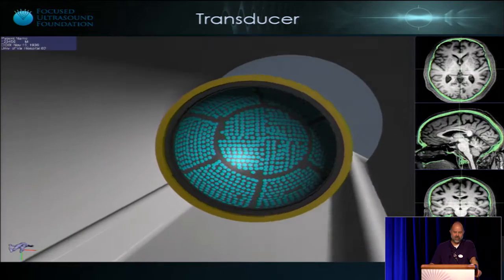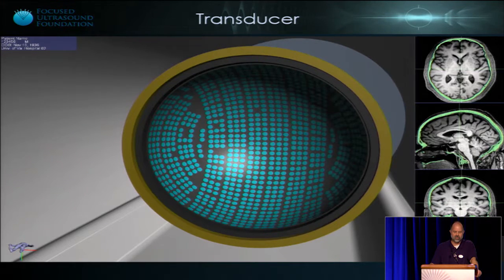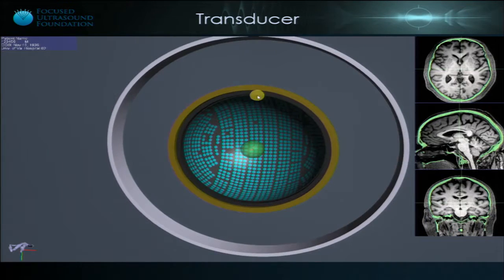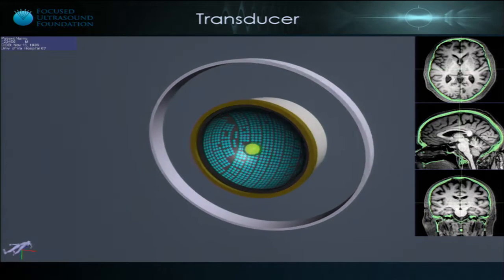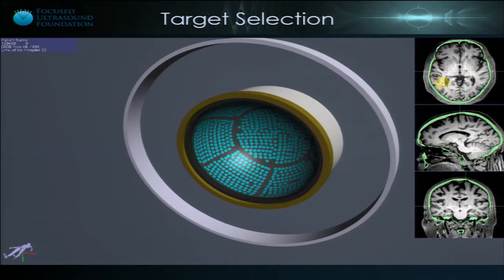In collaboration with Insightec, we've modeled the Exablate Neuro in both of its frequency variations. This here's the 650 and then the 220. And the focal spot and the steering volume. And we'll take away the MR model and just leave a ring representing the MR bore. So we can pick targets.